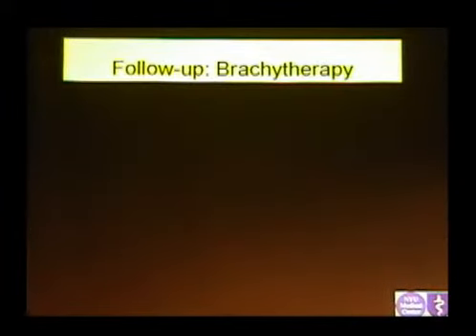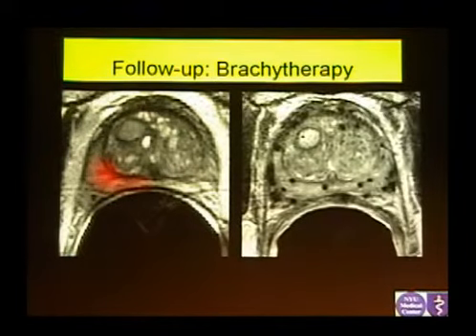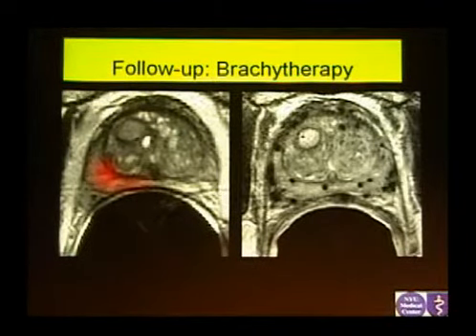So you can also use MRI to follow up treatment after seed implantation, brachytherapy. This patient had prostate cancer in the right peripheral zone. This is a choline map. You can use any color map, any coding, to quantify the amount of choline. This is a choline map showing you cancer. And the patient had multiple seed implants, seen as these black holes everywhere. It's interesting when you look at patients with seed implants, you can also localize the location of the seeds.